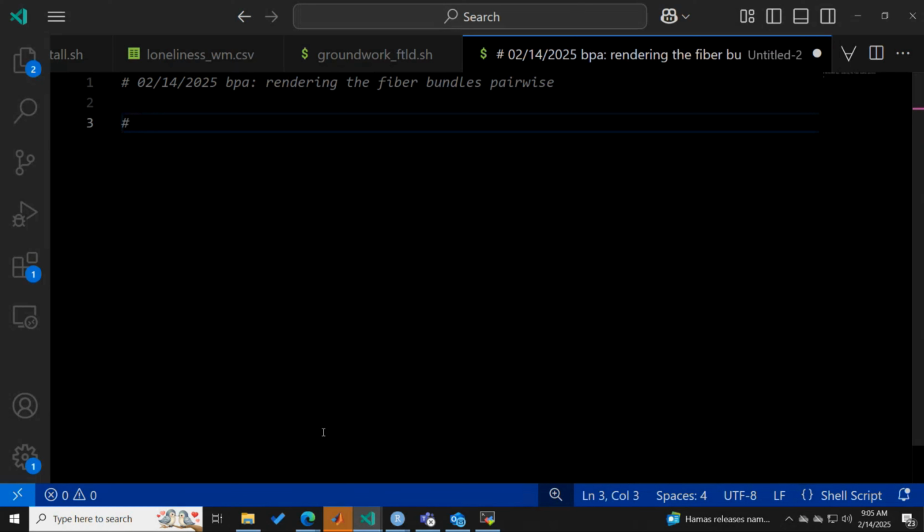an underlying scalar map. I think let's start simple. I don't think we should start too complicated right away. What we need is an underlying 4D template for the underlay. Do we want the actual FOD template, or is the anatomical image fine? Yeah, anatomical is fine. It's just for the underlay. I'm putting it in the chat right now.